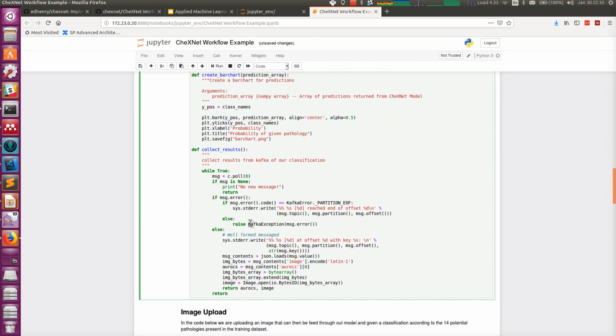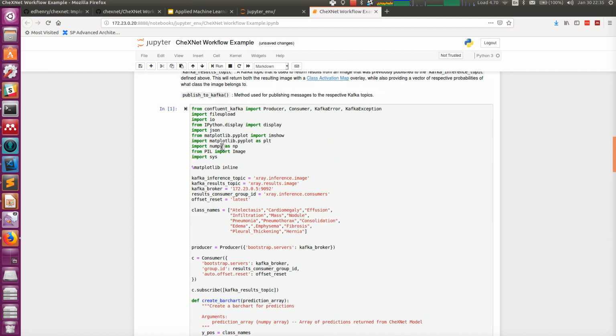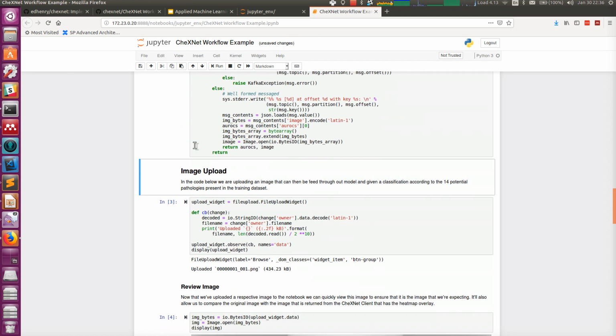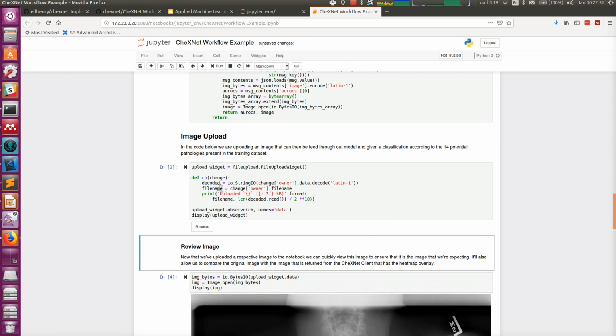If we go ahead and click the Run button on this particular example, all of the code in this cell has been executed, and a good indicator of whether or not this cell has been executed is this little counter that gets incremented, along with this indicator that shows that this cell has been run. Here we're going to define what is called a widget in a Jupyter Notebook context. You can also shift enter on a cell and it'll execute that cell for you, and you can see here that this little browse button was generated.